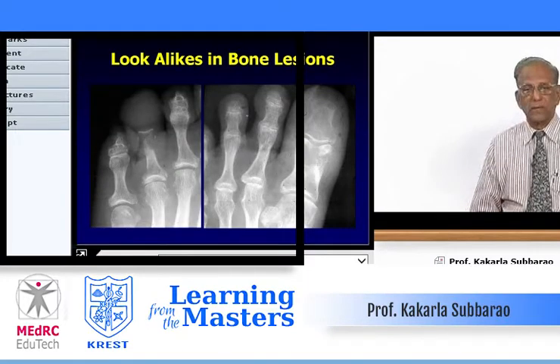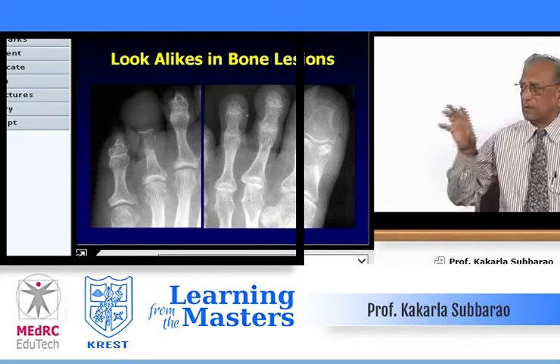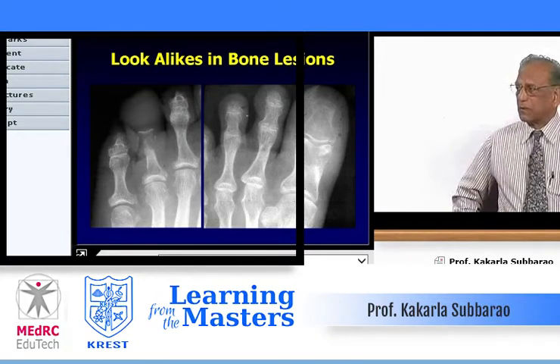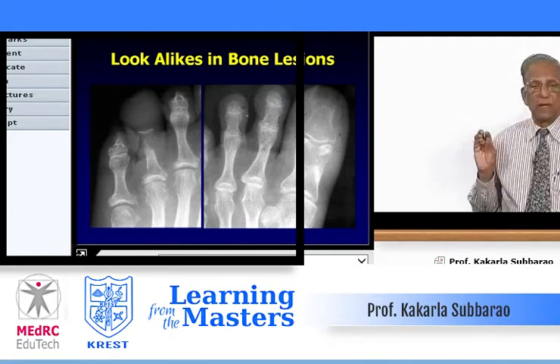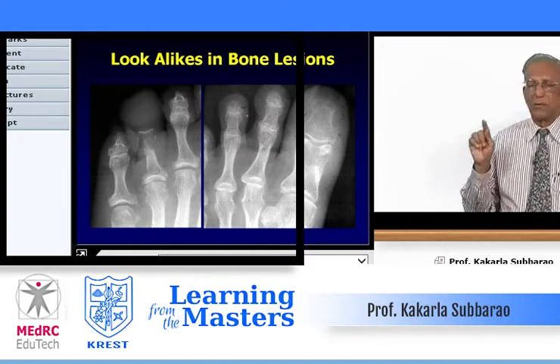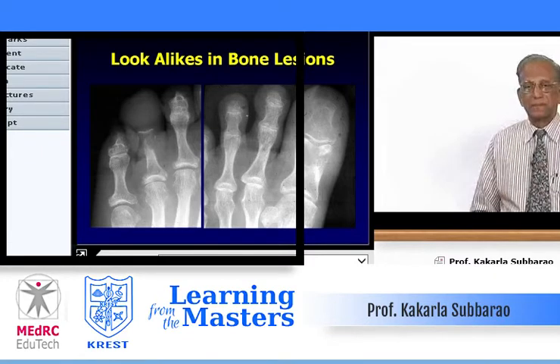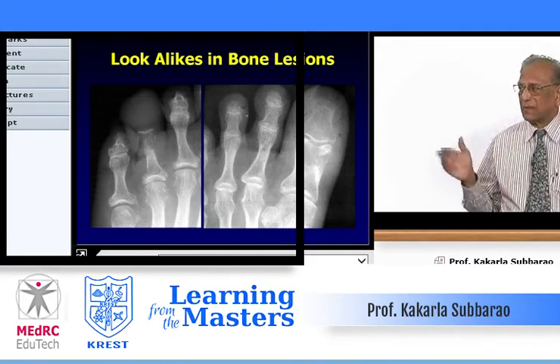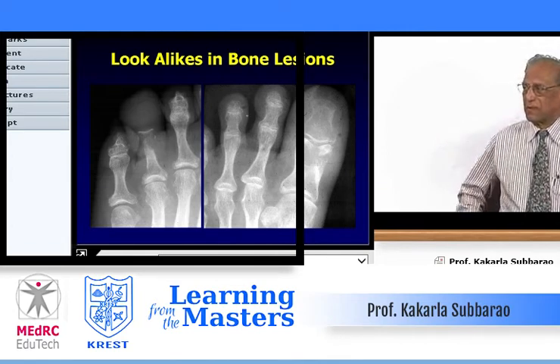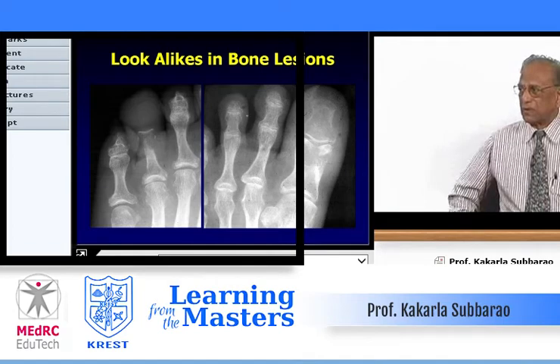Again, feet coned on the phalanges and the toes. The one on your left side, the distal phalanx completely disappeared. The proximal phalanx has got lytic changes, and there is a huge soft tissue swelling. So what is it? And again, he's an adult. You're going to see the degenerative changes at the interphalangeal joints or metatarsophalangeal joints.